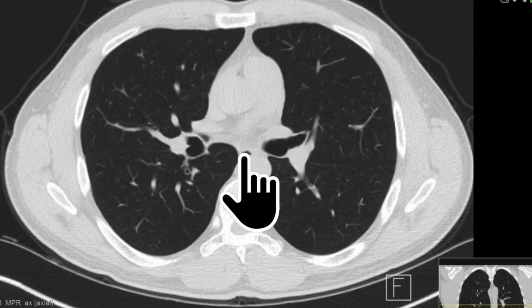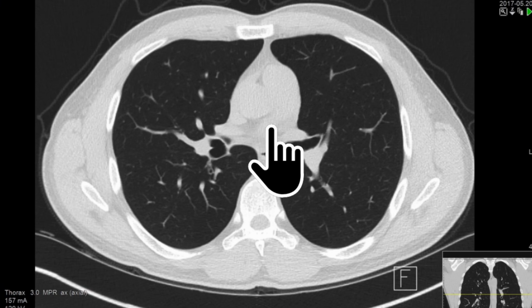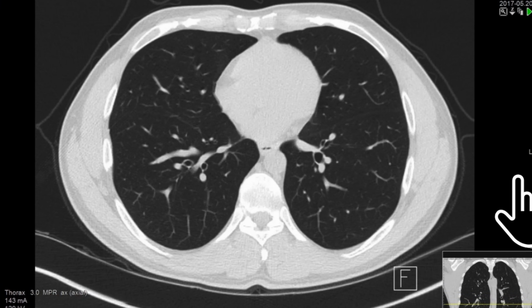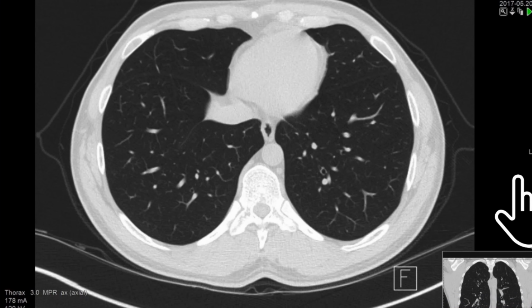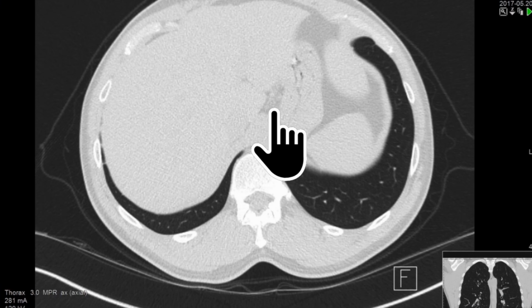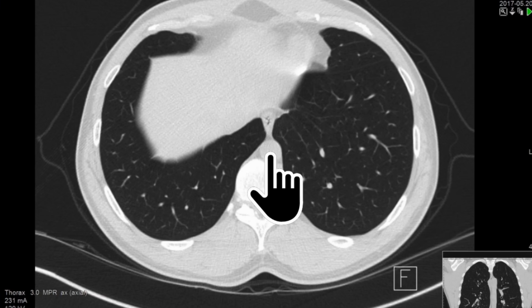So the esophagus, you know, it can get squeezed closed. It could have a little bit of air in it. So there's the descending aorta, vertebral body, esophagus. The trachea has now become the main bronchi. If we continue descending, oh, it's kind of disappeared. Oh, there it is. Now it should go to the left, shouldn't it? It should. Difficult thing to say with anatomy, it should. Anatomy is what anatomy is. It's not what it should be. Ah, there we go. You can see it there. Yeah, so here, and there's the esophagus, there's the descending aorta.